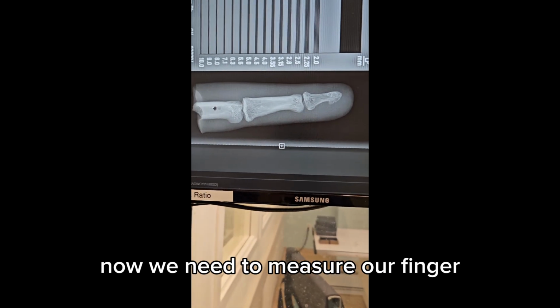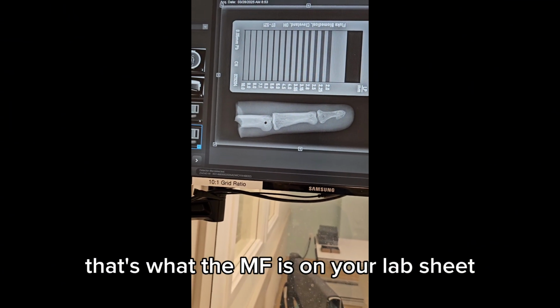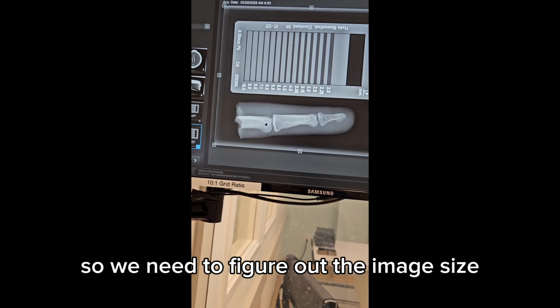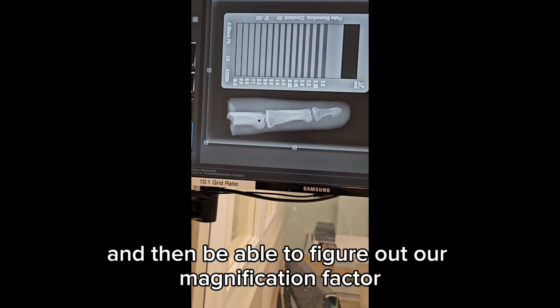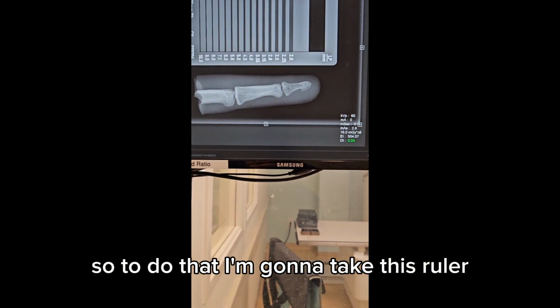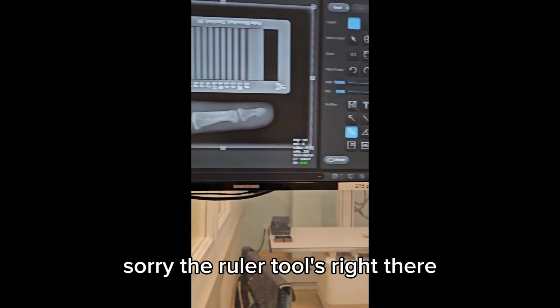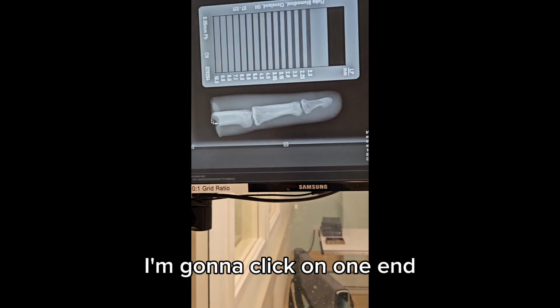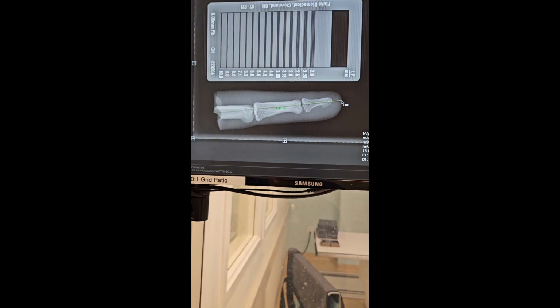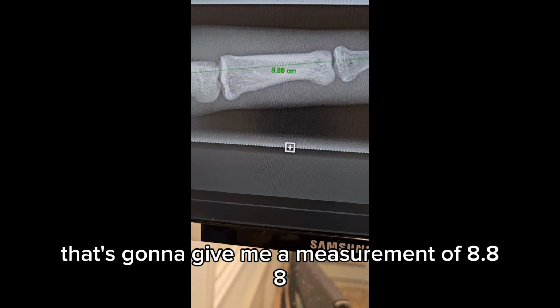Now we need to measure our finger to be able to see how much magnification factor we are. That's what the MF is on your lab sheet. So we need to figure out the image size and then be able to figure out our magnification factor. To do that, I'm going to take this ruler, the ruler tool's right there. I'm going to click on one end, bring it across to the other end. That's going to give me a measurement of 8.88.